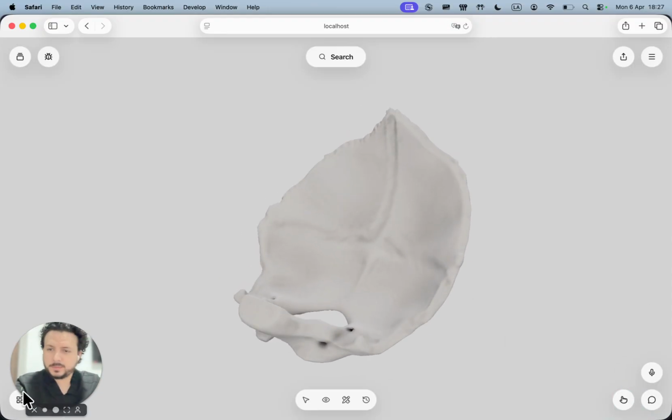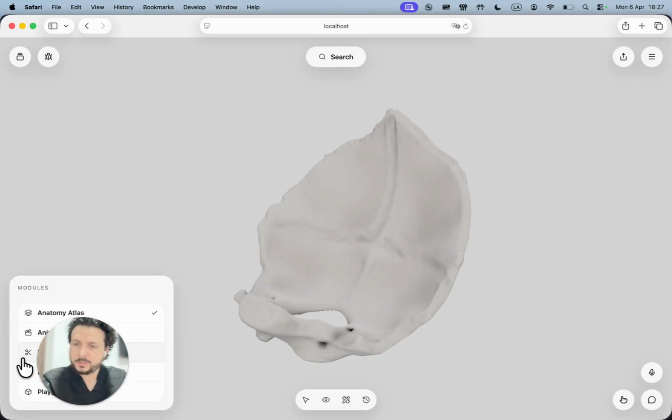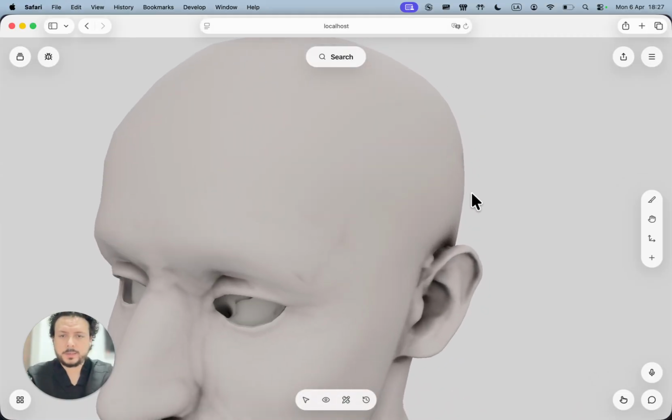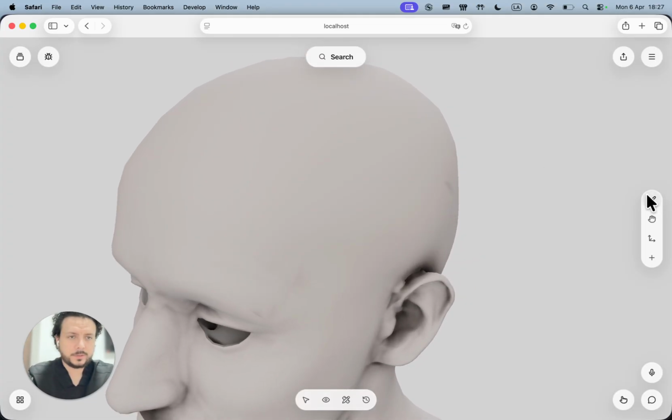Now, the app has many different modes. One of them, for example, is animation, virtual surgery, and AR. Let me show you a virtual surgery since I think it illustrates a lot of the capabilities. For example, what we have here is a 3D model with our skin. We can plan for surgery. For example, let's say pre-surgery, we're going to perform a Dandy incision for a craniotomy.